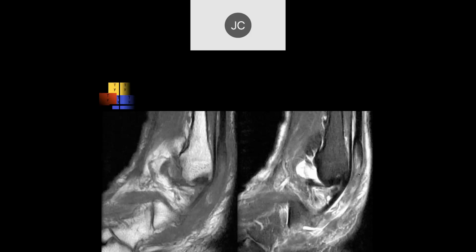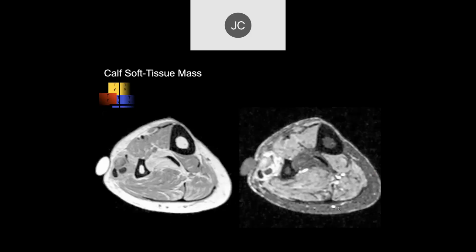When I first put this in, I thought it was an injury at the level of the lateral malleolus, but I think this is a more distal injury with proximal retraction of a full thickness tear of the longus. And you can see a lot of degenerative disease. As you remember, we talked about, best studied in the shoulder, but almost all tears of the tendons are in areas of severe tendinopathy. So they develop the degenerative disease and the tendinopathy first, and the tear comes second once you weaken the tendon with tendinopathy.